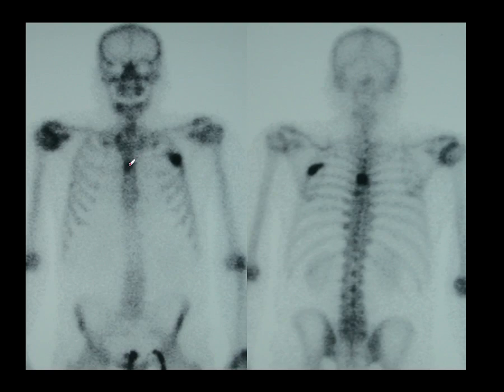That's called shine through. So that is, in effect, a posterior lesion, the activity being seen posteriorly, but also shining through to the anterior camera. So it's seen on anterior and posterior camera heads. Now this obviously causes a problem because, of course, it might be difficult for us to localize the site of the activity, and here's a case in point.